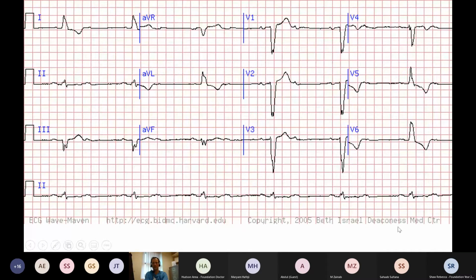So what about this ECG? So Mobitz type 2 has been suggested. Does everybody agree with that, or just looking here, can you not see P wave, QRS, T wave, P wave, QRS, T wave, P wave, QRS, T wave? Is this not just left bundle branch block and sinus bradycardia?